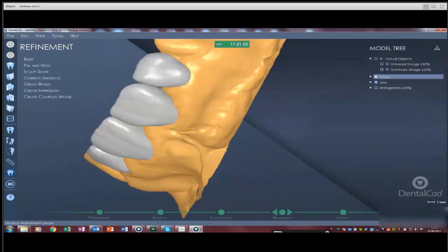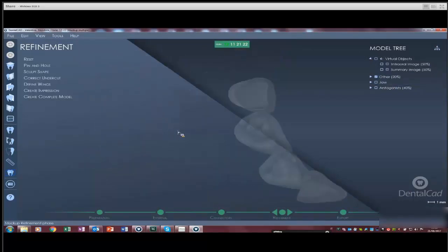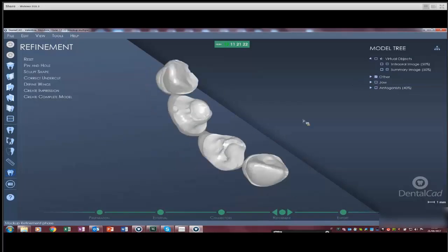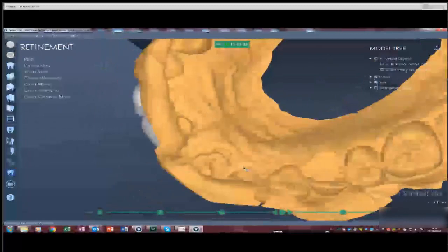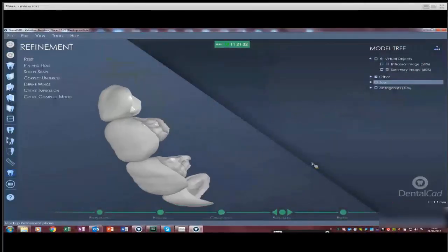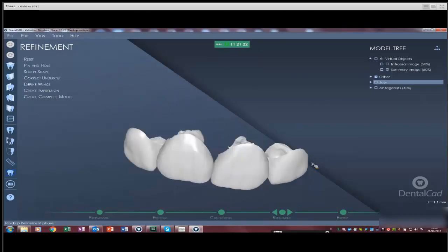We have reduced them and we have obtained empty laterals. But given that we didn't have any tooth for the central incisor, we didn't have any reduction for the central incisor. So, in one single project, we have been able to print, or mill, as you prefer, the laterals as provisionals before the preparation, and full crowns for the central incisors.